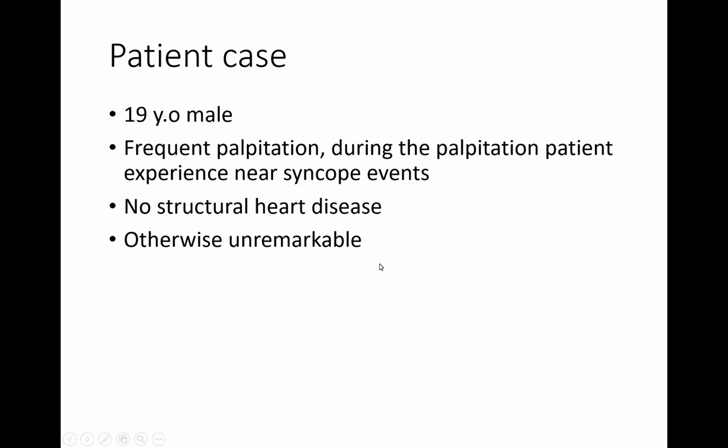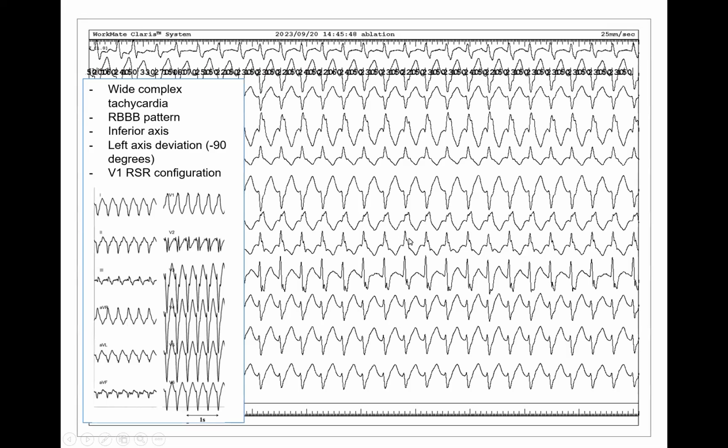The patient experienced near-syncope events, with no structural heart disease and otherwise unremarkable findings. So here is our EKG during the VT. Actually, I couldn't find his real EKG, and I found only this EKG from his EGM. So as we see here.